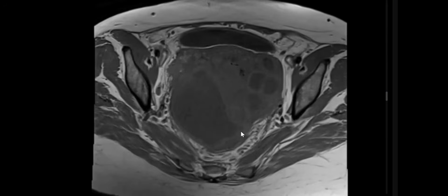If no history is given, my friend, with this tubular structure, any differential? Hydrosalpinx, hematosalpinx, pyosalpinx. Very good.